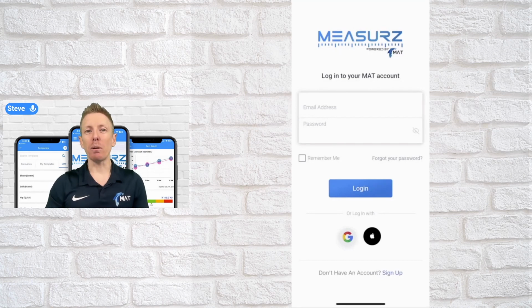In this video, I'm going to take you through how you set up your own account, which is what you'll need to do before you start assessing your patients and clients. Now, if you have any questions along the way, we've created a number of great resources around the Measurz app to help you get started.